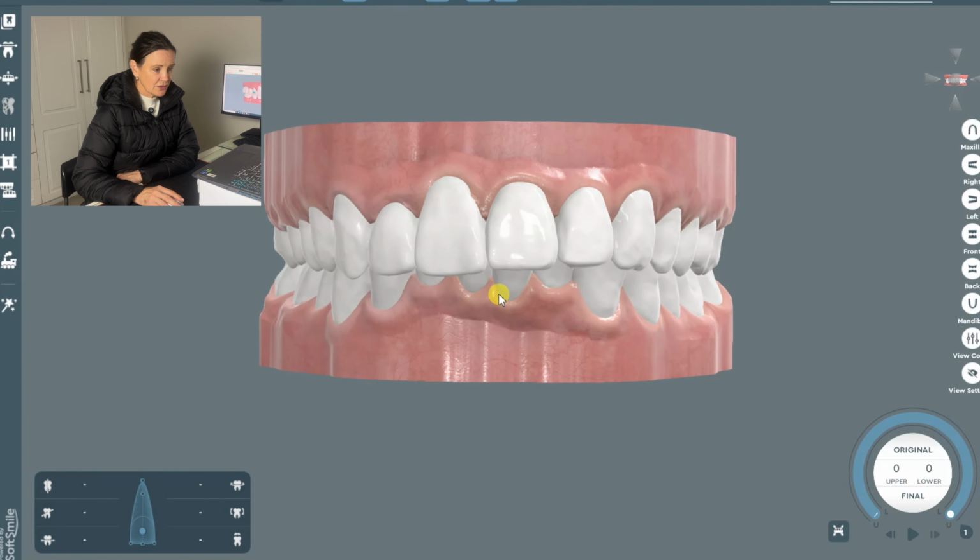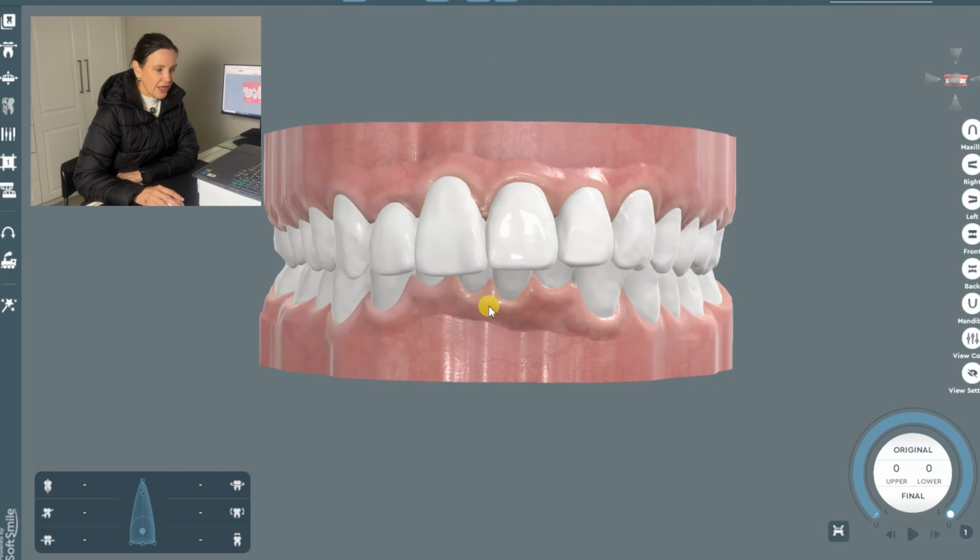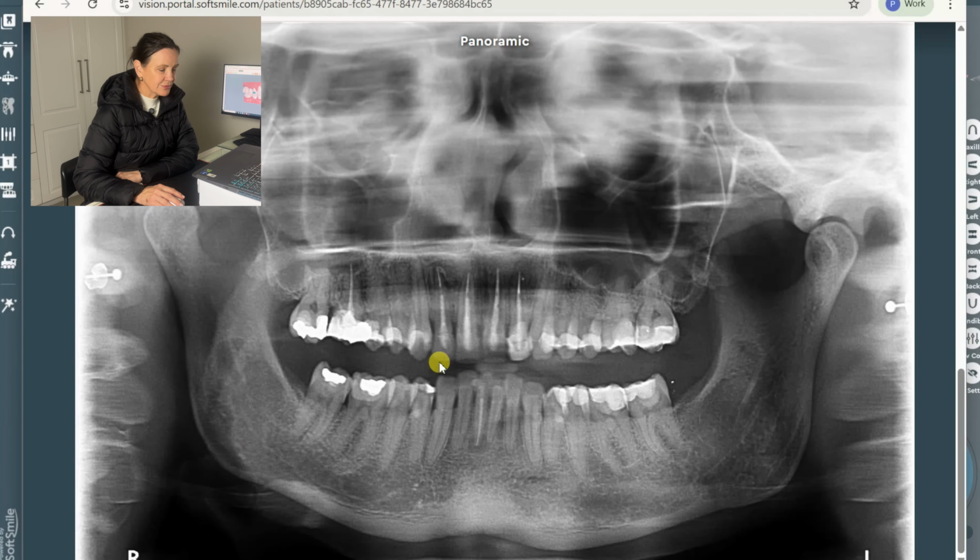The patient's main complaint is, I don't like my bottom teeth, I want them straight. The dentist added, because of the crowns, let's just have a look at the teeth having posts in them, and the risk of moving them around, putting force on them, the dentist requested no movement on the upper teeth.